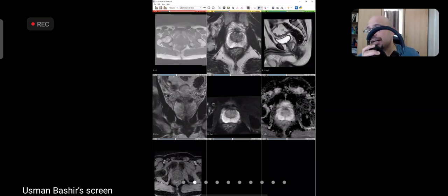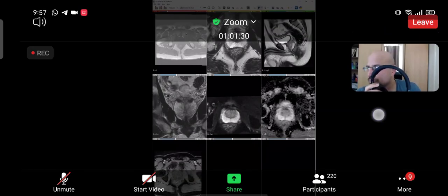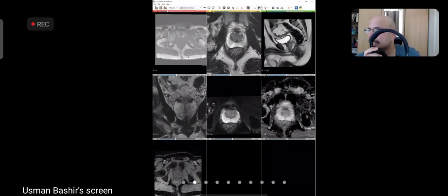So that fat resides in the subcutaneous tissues everywhere. Okay, these white bits. Then you've got the bones, the marrow, inside the femoral heads and necks. That's all fat. So you can see in the fat suppressed image, all of this is black. Bones are black, right? And the subcutaneous tissues are black. So these are the series of images that we look at. Let's start.